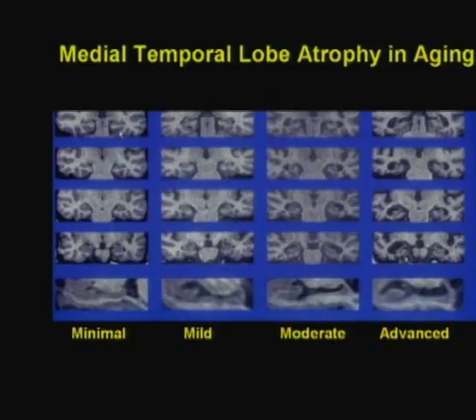So what you can actually do is you can create a template of the characteristic size or the median size and configuration of the hippocampi shown here in cross-section on a patient with very minimal cognitive impairment. That's not considered dementia, so-called mild cognitive impairment, or MCI, though there's a risk for developing dementia on follow-up studies. This is what you see in the typical MCI patient. So anteriorly, you're at the amygdaloid nuclei. You get back into the head and body and tail of the hippocampus.